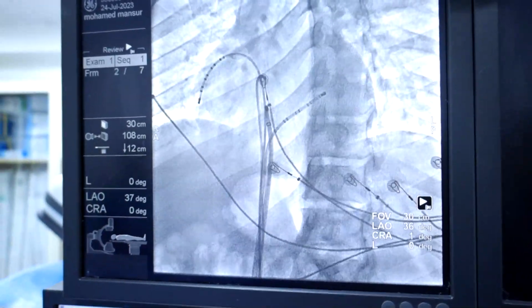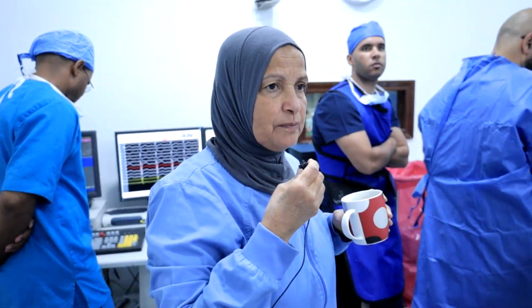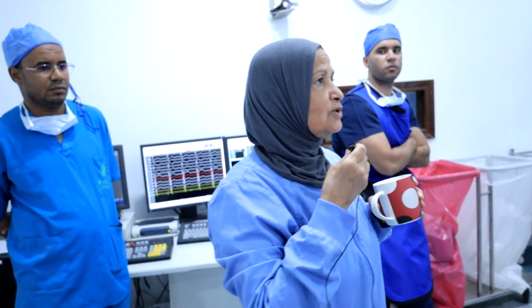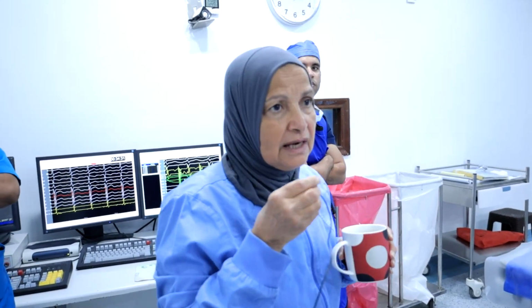Excellent. So this was a nice case of atrial tachycardia. We diagnosed it by the Holter, and then by electrophysiology confirmed by V pacing during tachycardia, no VA conduction, and then we gave isoprenaline and adrenaline. But the potentiation was helped by isoprenaline in the beginning. End of study.